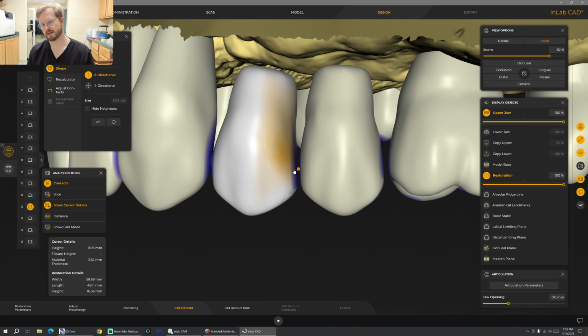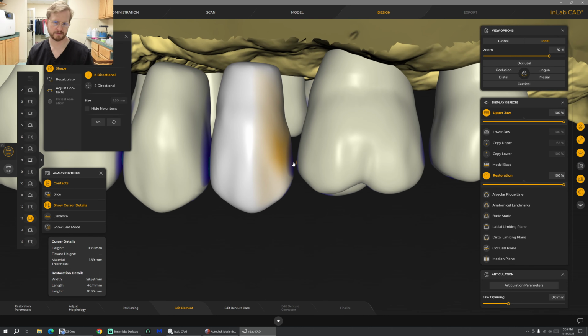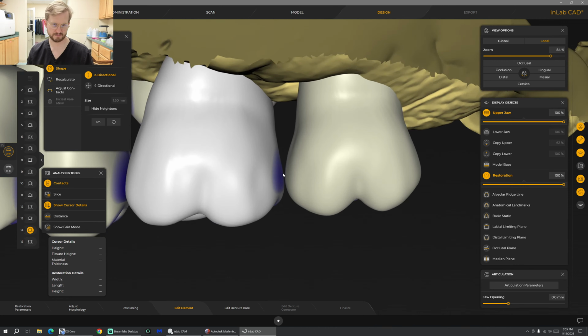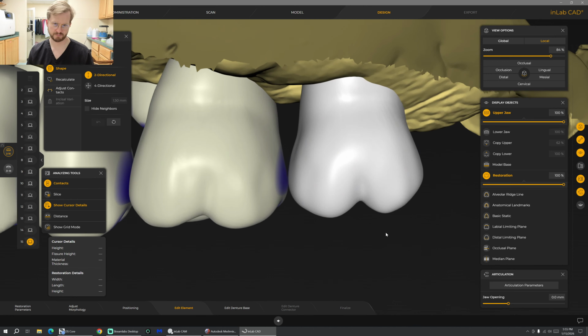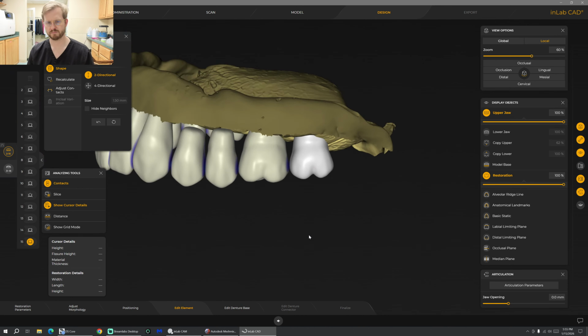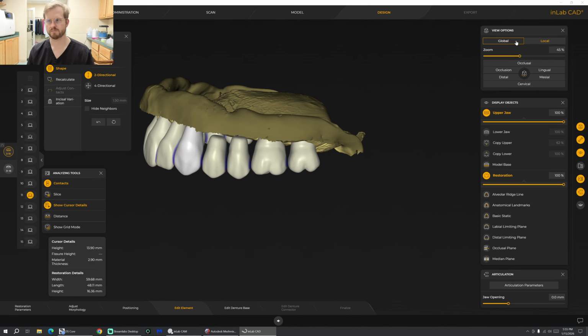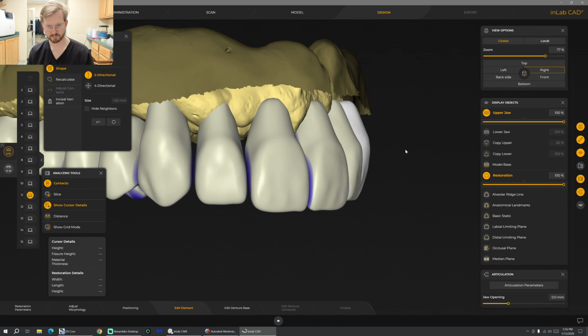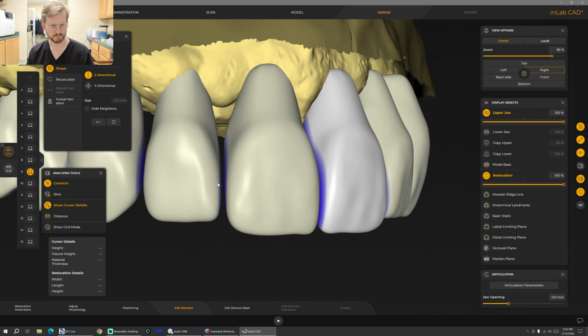I don't really have to close all of these. Like I could just rely on my connectors, but where's the fun of that? We can spend a little extra time doing it. Again, shape anatomic.